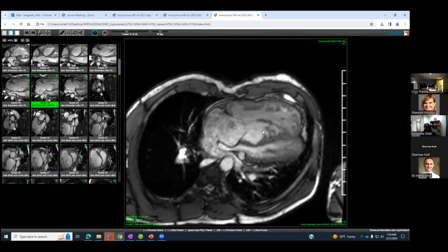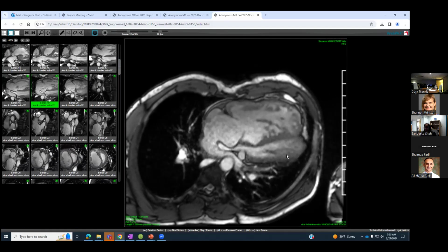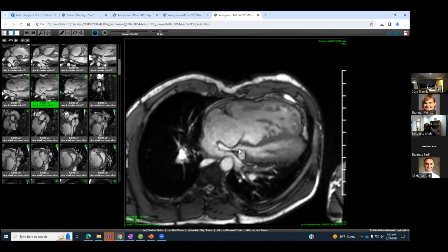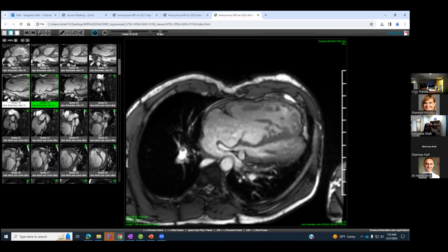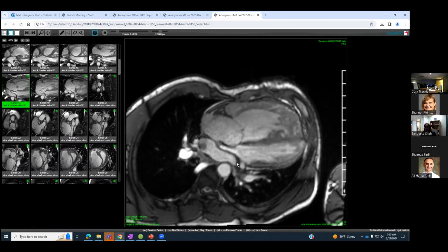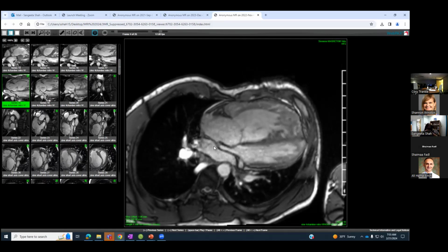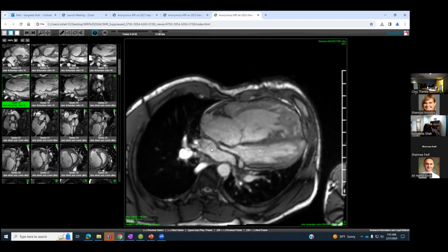This is showing tricuspid regurgitation, systemic RV. Here's your LV. Here's your pulmonary venous baffle. This is your systemic venous baffle, which is right here. You don't see the full extent of it. We take 4-chamber stacked images and you start to see how small this area is. So baffle stenosis is coming into play.